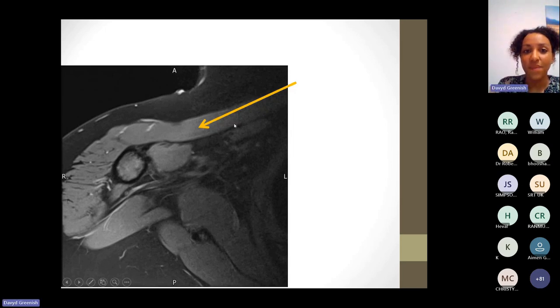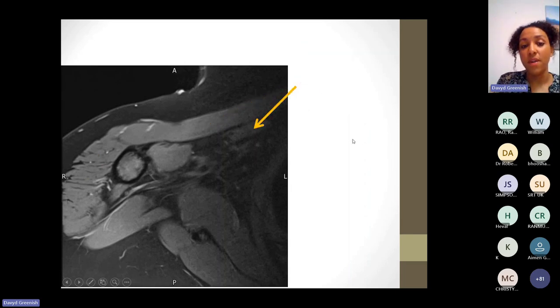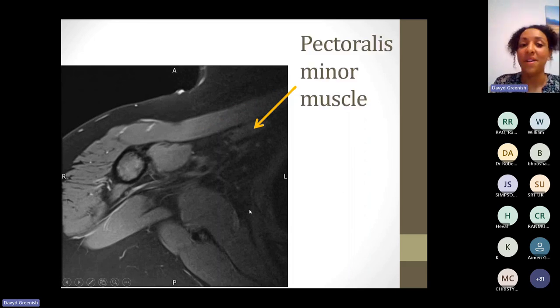So this one is pectoralis major, because you can see that it's going off anterior to the chest wall, and it's not any of the muscles around the shoulder, for example. Deltoid here has that classic streaky appearance laterally. So this is pectoralis major, going off towards the anterior chest wall. And in that case, as we've orientated ourselves already on this image, this muscle here is pectoralis minor.